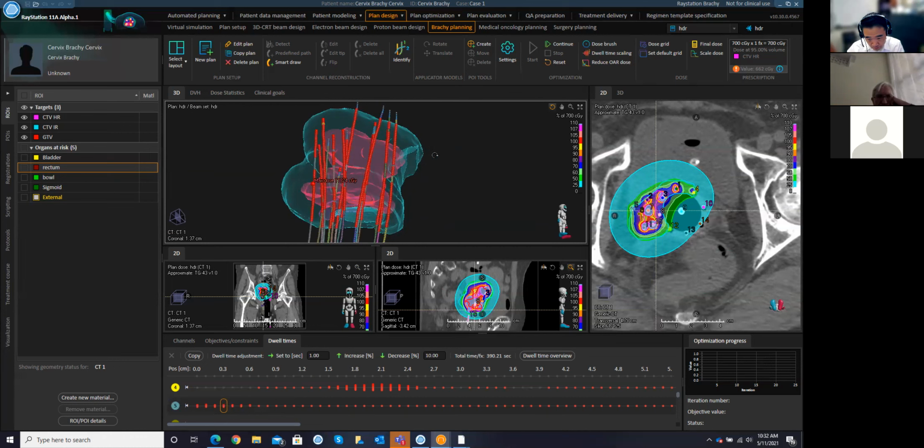But when it comes to robust optimization, if you don't have the 4D, you can say, RayStation, I want you to understand that this gland may swell or it may move in XYZ, pitch, roll, any direction that you think this may happen. The optimization will be based on assuming that it has moved, so that if the structure does move or does swell, it's covered.